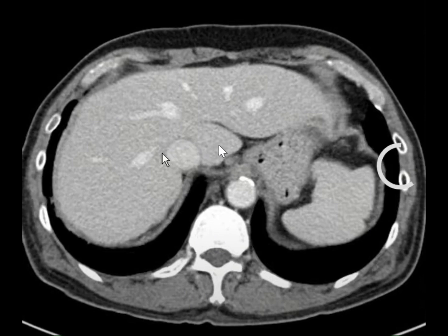Whenever you see the caudate lobe, this is the caudate lobe, and the IVC inside the liver, this is the upper hepatic segments. So I can see 1. So I will use the hepatic veins to divide the hepatic segments. This is 1, this is 2, and this is 4A, and this is 8, and this is 7. 1, 2, 4A, 8, 7.